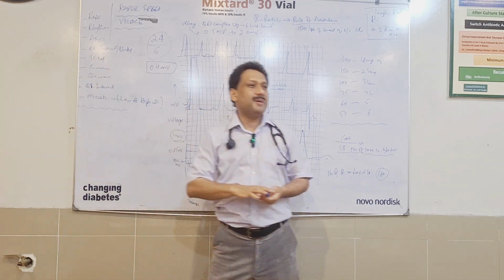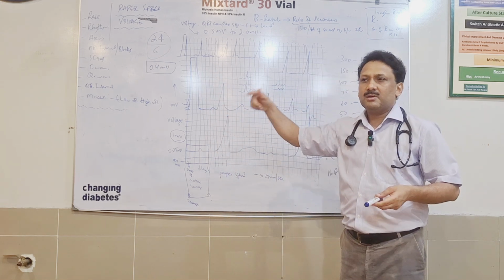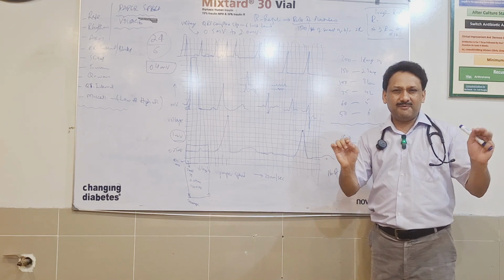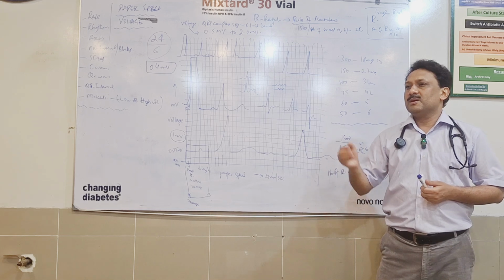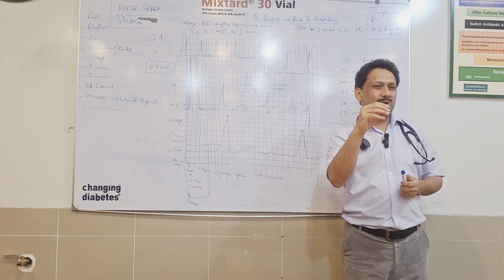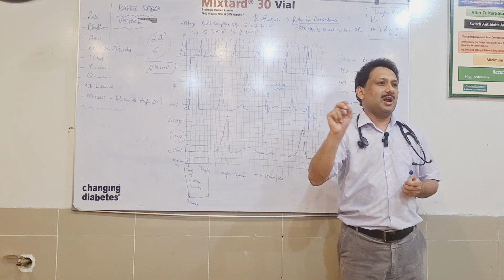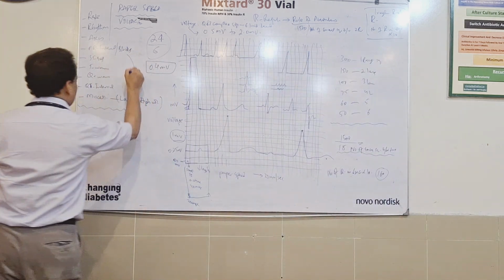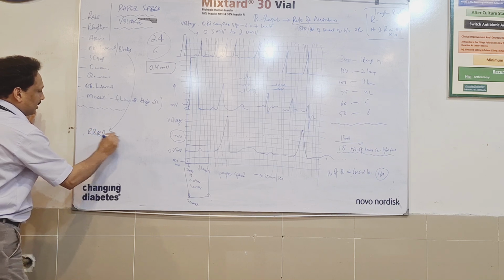And as far as right bundle branch block and left bundle branch block are concerned, we talked about those blocks in the arrhythmia section, but just to give you a very small basic principle, if someone asks you what is there on the ECG, and you want to pick right bundle branch block or left bundle branch block, what are the basic principles? One thing, blocks. So RBBB, LBBB.